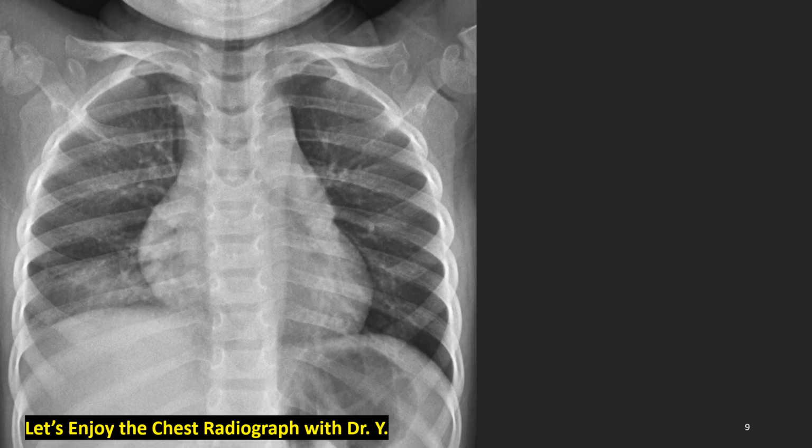How do you feel with this film? Please look closely and slowly, and please find out what's the difference with the previous right middle lobar pneumonia. You got it? Consolidation here to here and here.